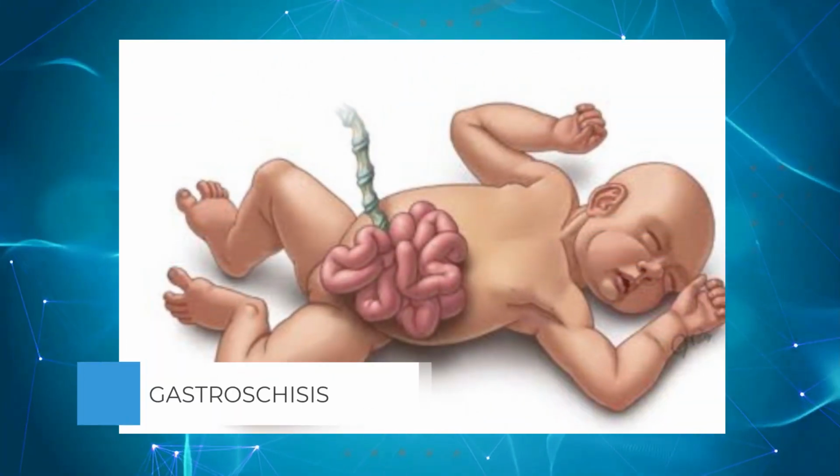Let's go deeper and let's discuss gastroschisis on ultrasound. Let's define what fetal gastroschisis is. What gastroschisis means is when you conceive and there's a baby growing in your womb, sometimes the anterior abdominal wall on the baby does not close up. So what happens is these intestines are just seen floating in the amniotic fluid.